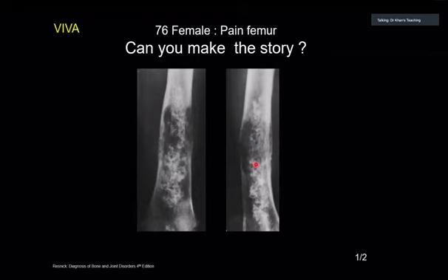But the point is, this is what we call a story case. Story cases are favorites in the exam. A story case is a story which the case tells you, and they come in the FRCR so often. The story is that there is calcification, and the calcification has a ring and arc or flocculent type of appearance, which means an enchondroma. Now there is a malignant transformation. Of course, you can keep bone infarct in the differential. I will consider it, but the examiner is asking your thinking, and you will say that because it is not serpiginous, that is less likely.